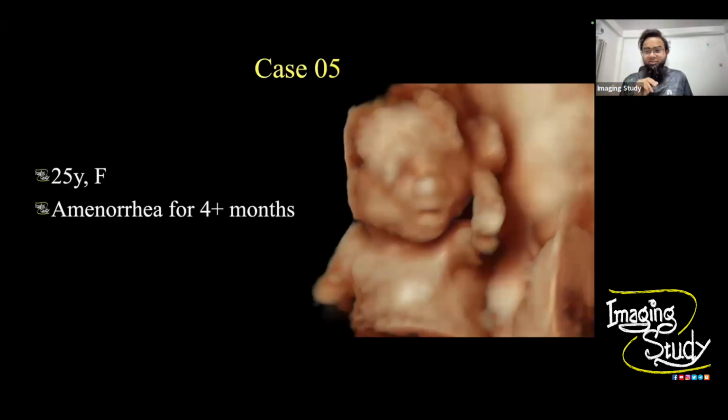Okay, so let's do the case of the day, and obviously it will be a pregnancy case. I have collected multiple pregnancy cases for you. Due to the time, it will take long to share all of them with you. So anyway, let's start with the interesting one. I think this case is a fresh case, not very long ago. It's from the Thursday before this week. So let's see what we have got on ultrasound.